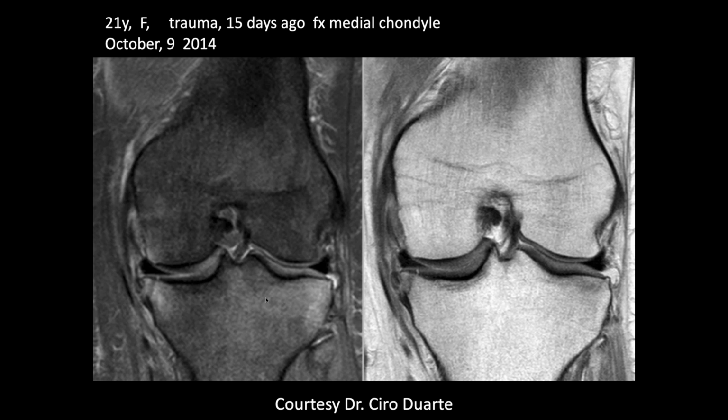I think it just depends upon the mechanism. It just strikes me like it should be more, because that's where the impact is. The avulsion is on the medial side, but the impact is on the lateral, so that's where the real trauma is, which makes me think this might be a little delayed.